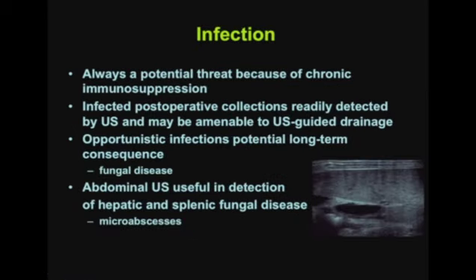Infection is another common problem. It's always a potential threat because of chronic immunosuppression. Infected postoperative collections are readily detected by ultrasound and may be amenable to ultrasound-guided drainage.